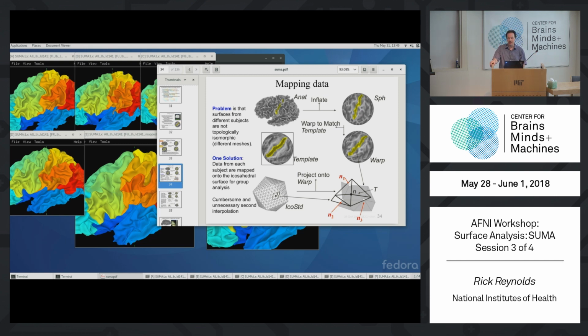So if you're using the icosahedron surfaces that are at the same resolution, so for this class we'll use resolution 60, which is actually low resolution but saves time for processing, then you have correspondence across subjects according to this FreeSurfer registration step.